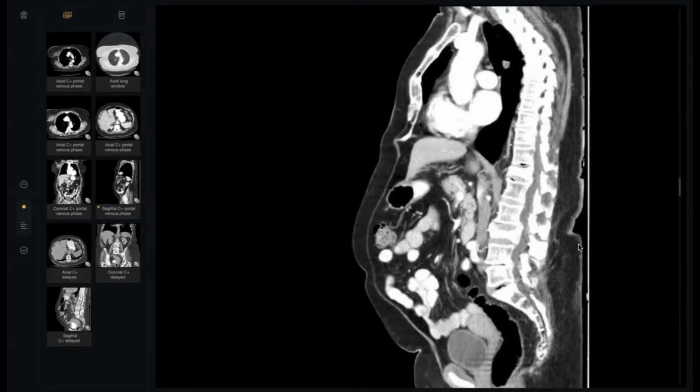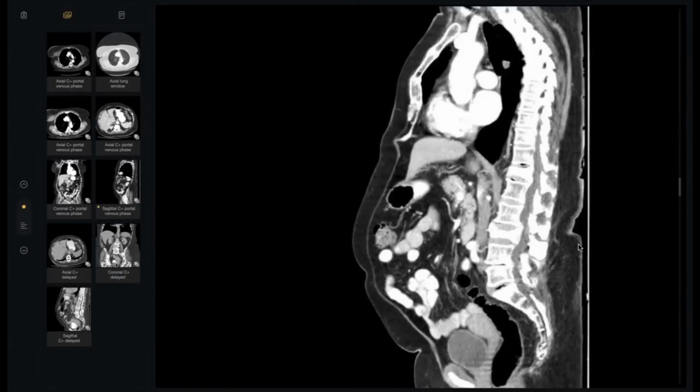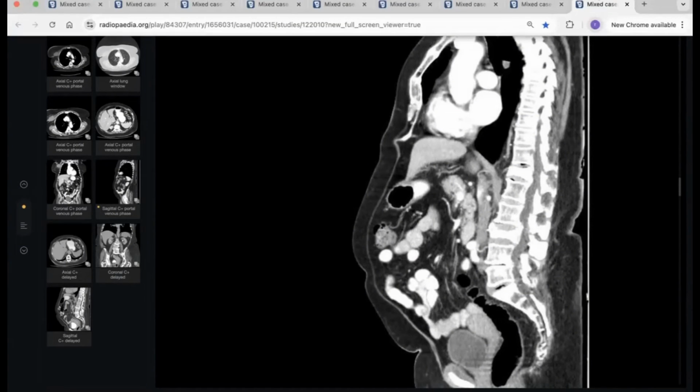Okay, at this level, to me, it is suspicious for a malignant process because there is retropulsion. Excellent. Thank you. It may be due to metastasis. Why? Look at the posterior aspect, convex. Increased volume here, so convexity. Thank you, doctor, so much.